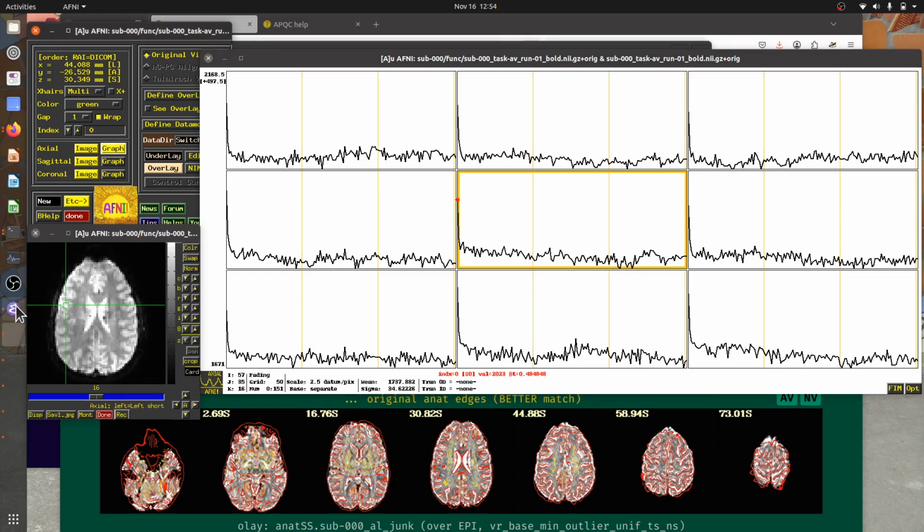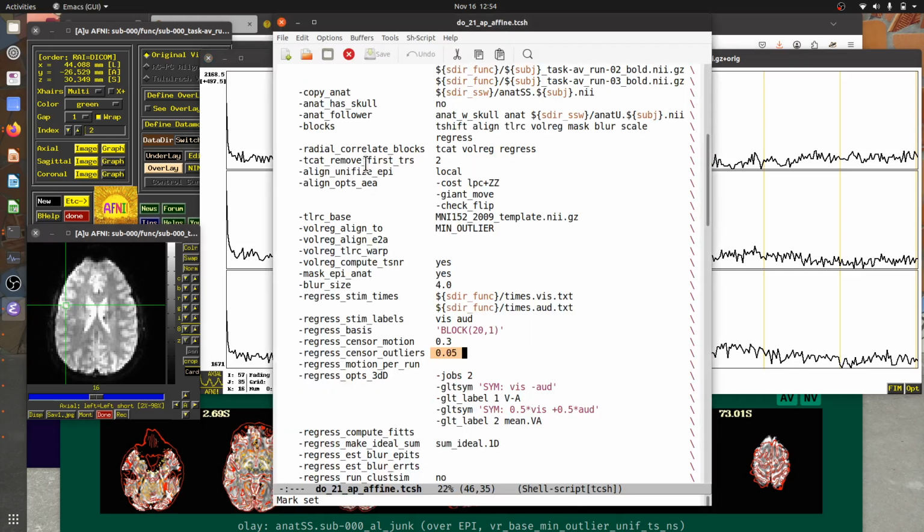And in our processing here, if I hit the right arrow once, twice, we can see by this point we're down in the regular time series. That's why during our processing, we left off the first two TRs of our data. They were removed when we copied the data in. So in actual fact, we were aware of this. We included the fact that the raw data did have pre-steady state in our processing.